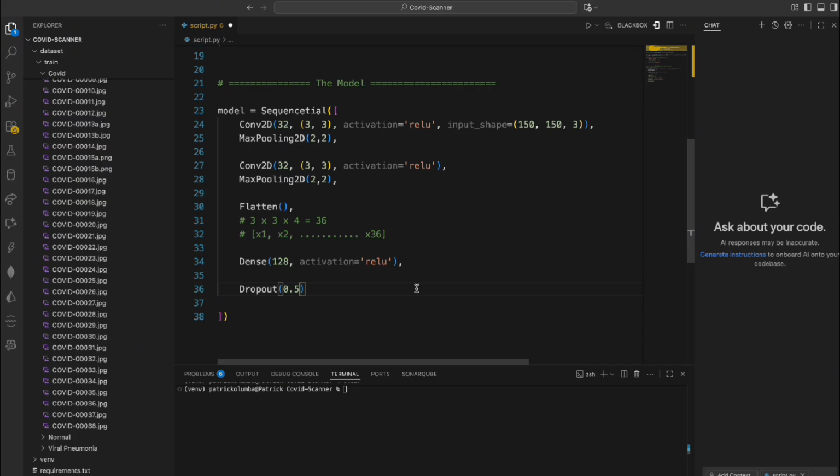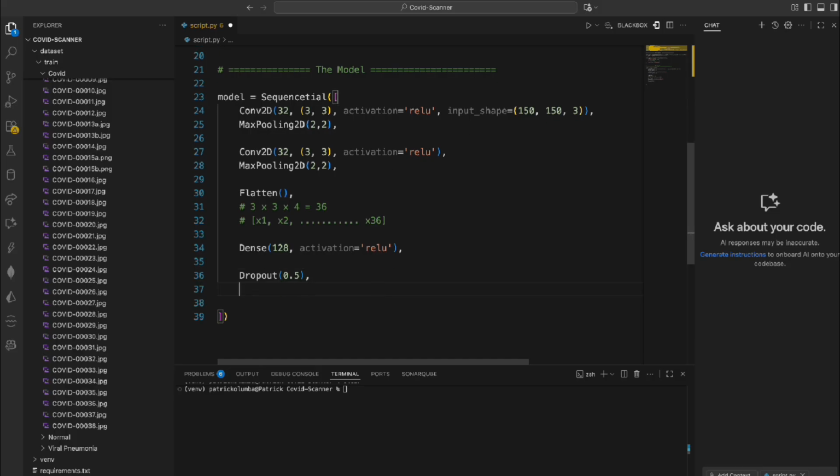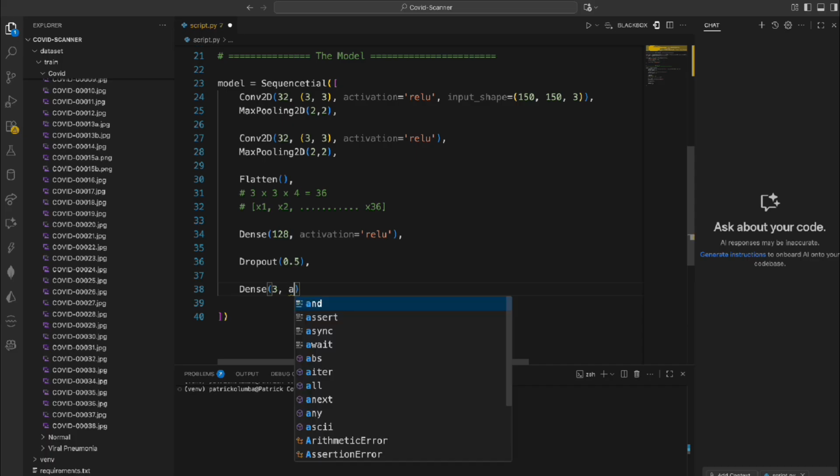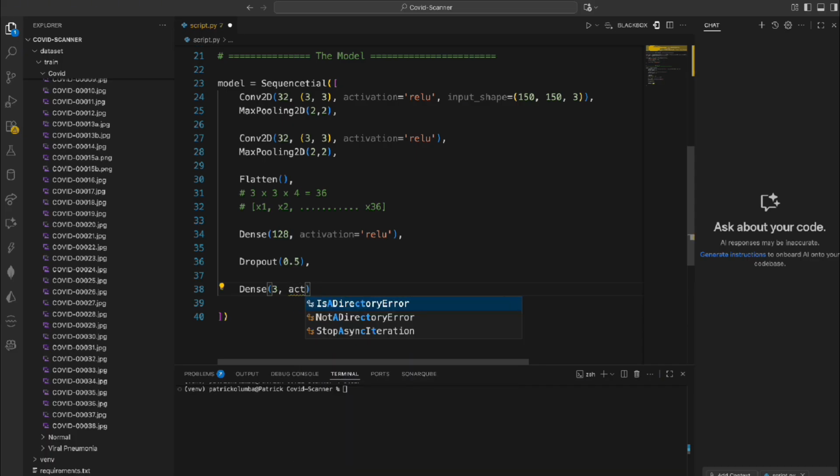And then finally, we are going to put in one more layer here, and that layer is going to be dense. Here we're going to pass 3, and in there we're going to use an activation. I'm going to explain this in a minute. It's going to change a little bit: instead of ReLU, we're going to use softmax, and I'm going to explain why. The final layer basically outputs 3 probabilities. If we were looking at 4 things, we would put 4 here, but we need 3, since we have 3 classes.